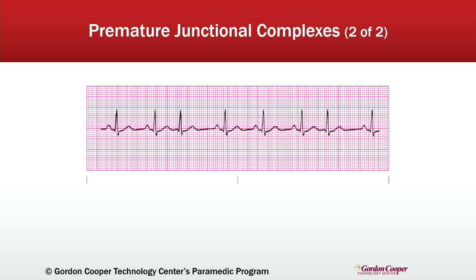So in this particular one, when we look at this, we see 1, 2, 3. Now we notice that doesn't fall in line with these. We'll notice that when we look at the rhythm. But 1, 2, 3, 4, 5, 6, 7, 8. And the rhythm looks a little off right here. That's unexpected because we do not see a P wave here. We see P waves with these other ones, except this one. So we see a hidden P wave.